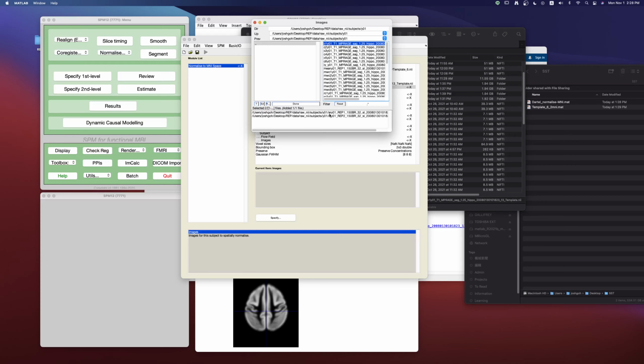And note, we do it on the slice time and motion realigned images. And these, again, are, the T2 and the T1 were all co-registered to this image. So that's why we can apply the SST parameters to these EPIs. So you have to be very clear and very careful that these are co-registered to the T1.